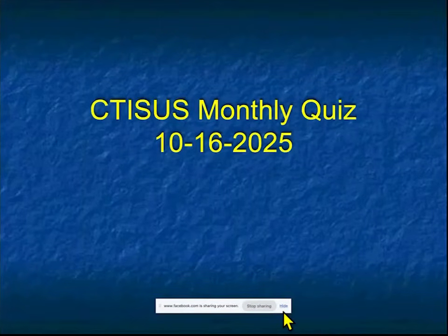Okay, hello everybody. I still have my stuffy nose and sore throat, but here we are giving you the monthly quiz. It's that third Thursday, I guess, in the month. So let's get started, and I have 10 excellent cases to show you.